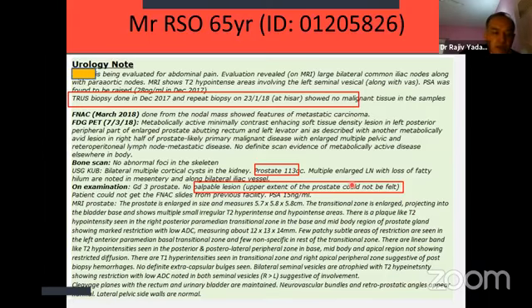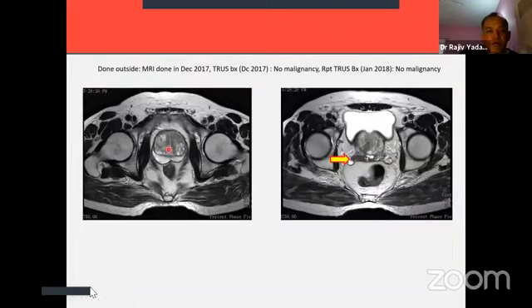And that was exactly the reason why 2 biopsies missed it. So this is the mid gland, normal peripheral zone, same patient. We got the MRI done in December 2017. So this is the MRI which was done, but unfortunately the person who did the biopsy didn't look at it. So even though MRI was done for the sake of doing it, if we do not see it, it is of no use. I'm not sure whether the radiologist was able to give this message or not, but the urologist is supposed to say, mid gland is normal, up to mid gland everything is fine.